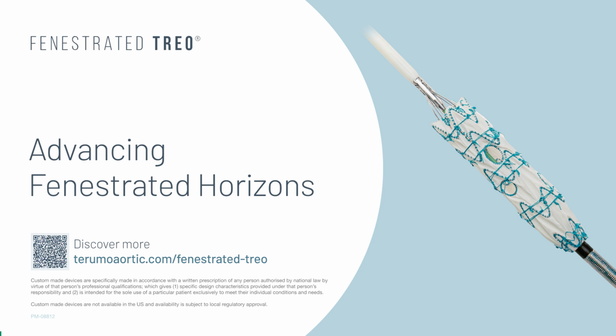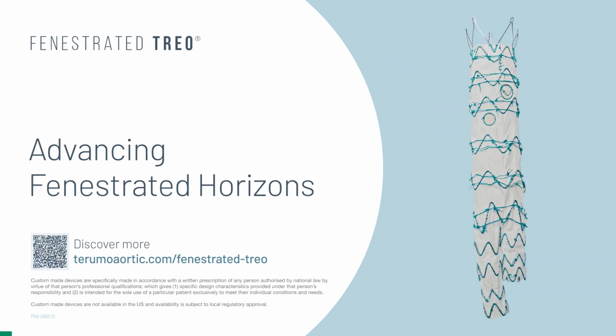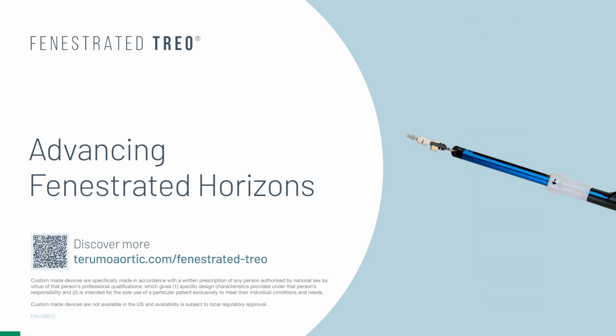The Fenestrated Treo abdominal stent graft system was designed to treat infrarenal, pararenal, juxtarenal, and paravisceral aortic aneurysms. Fenestrated Treo is based on the standard, simple Treo trimodular system, with a bifurcated main body stent graft with fenestrations and 2 leg extensions, each delivered via an endovascular approach and using its own separate delivery system.